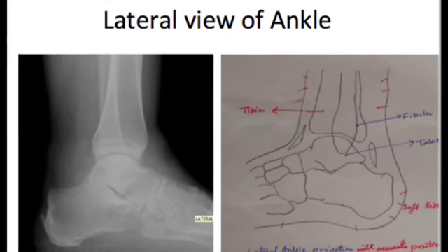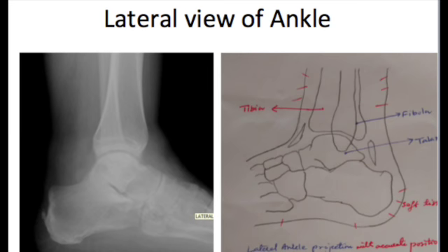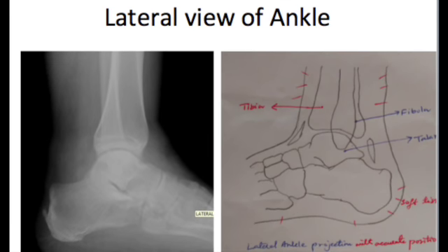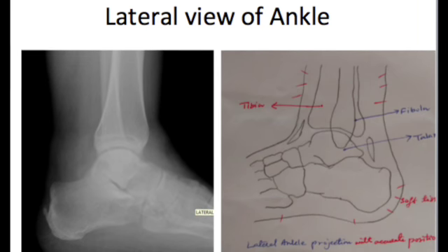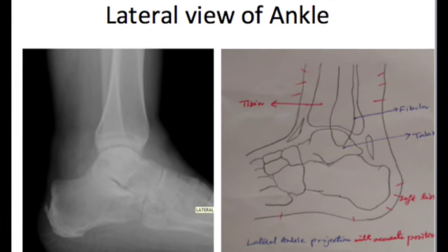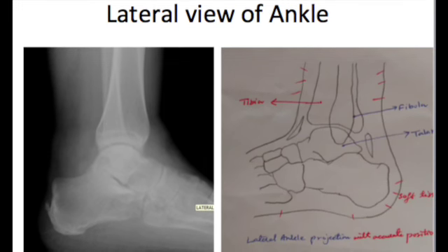The tibiotalar joint space is open, but some posterior soft tissue around the calcaneus is missing, because of the technique; contrast and density are not adequate to demonstrate those soft tissues. According to the doctor's report, there is diffuse soft tissue swelling, mild laterally, and anterior and posterior ankle effusions.